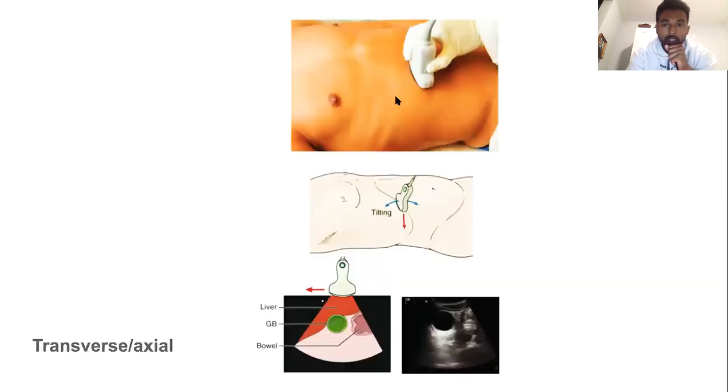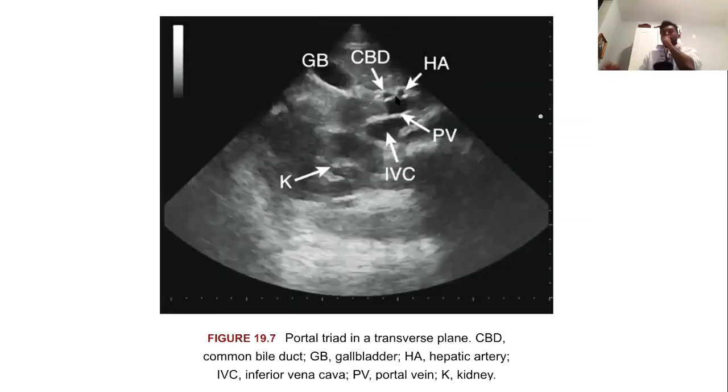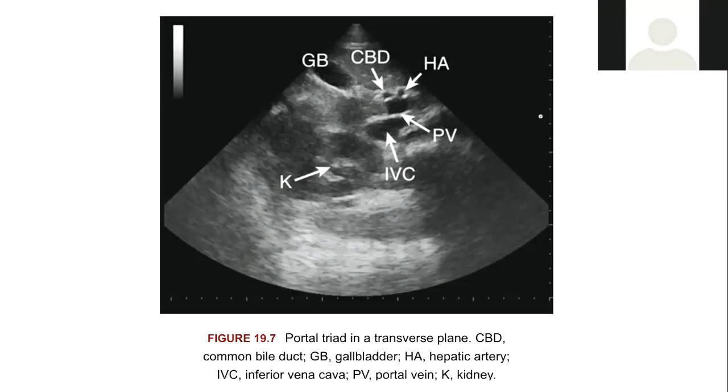Now, what else is in that area? What other normal anatomical structures, vessels, specifically? Remember how I said, whenever you look at an ultrasound, once you figure out where you are, think, what else is in the area, and then you start crossing them out. We already crossed out the common bile duct, hepatic artery, and portal vein, right? So what's left around that area? I don't know, man. I need to study for this.